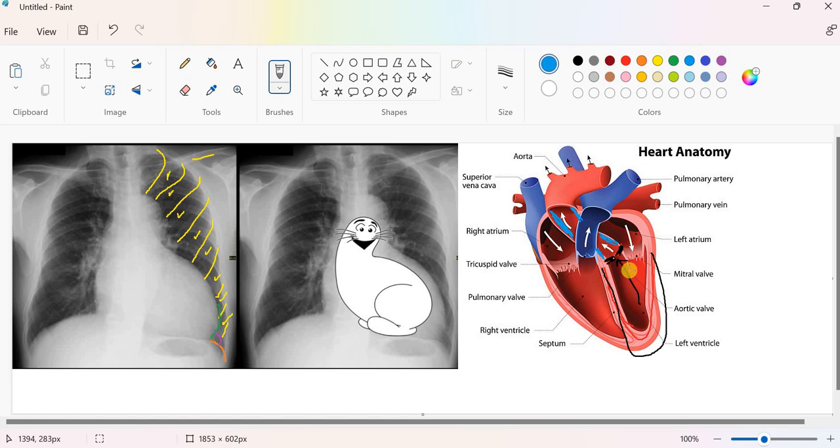So again the ventricle is pushing against narrow blood vessels, so it will be enlarged. So whether it is hypertension, whether it is aortic stenosis, it might be not this one and that one. It might be a third reason, like what? Like for example, aortic regurg.